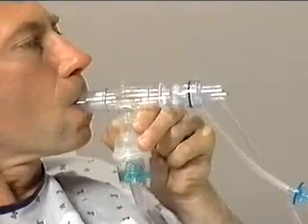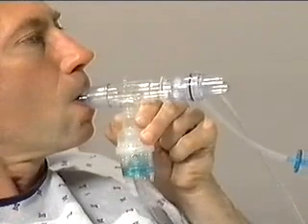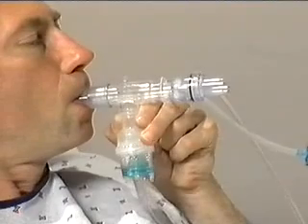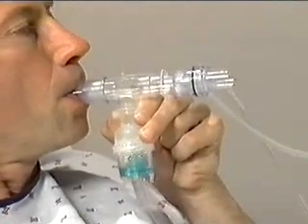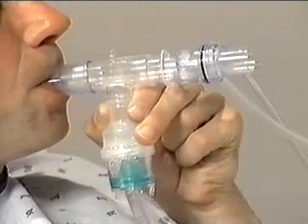Studies have shown a significant improvement in forced expiratory volume in the first second, in forced vital capacity, and in the peak expiratory flow rate when aerosol therapy is delivered in conjunction with PEP therapy. It's important that the device instructions for the EzPAP, as well as the intended nebulizer, are fully understood. The selected nebulizer should be used according to the manufacturer's instructions for use in a positive pressure system. Follow the setup instructions for each device and then verify that all connections are secure.